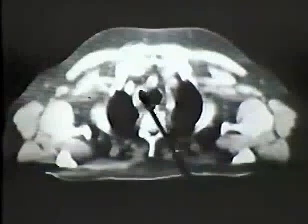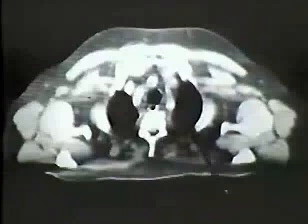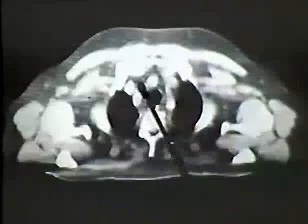This then would be the brachiocephalic artery, but wait, that leaves us with an extra structure. What's this? We have grown from beyond our simple 1, 2, 3 artery pattern to something extra. What are we looking at here that runs parallel to the tracheal wall, looks vascular, and is opacified with contrast material? To answer that, let me show you the arteriogram of a patient with a rather tortuous brachiocephalic artery.